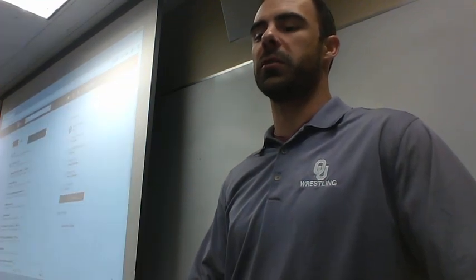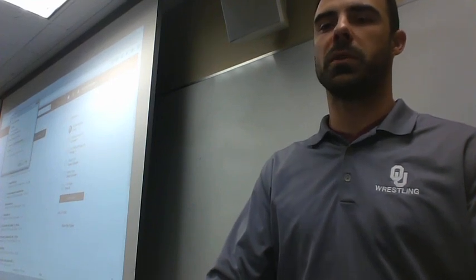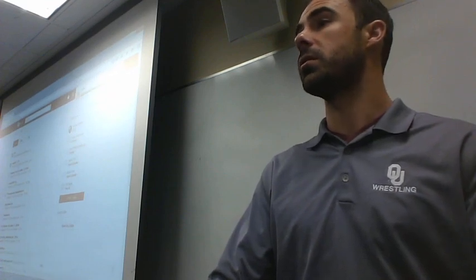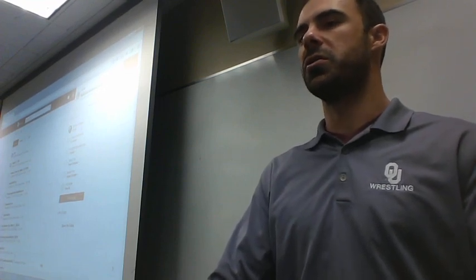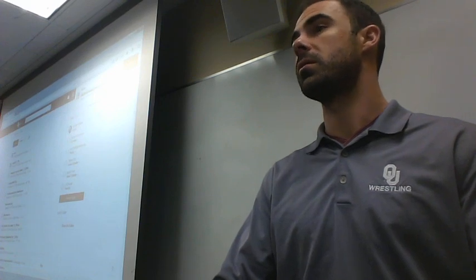These are fairly big files. These are raw EEG files, and we happen to record them at a very high sampling rate, so it's a lot of data. It takes a little bit of time to download, but that's okay. We're on a very fast connection here on campus. So this should be happening on your screen. If it's not, raise your hand.